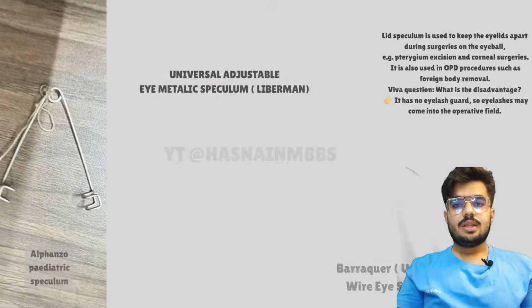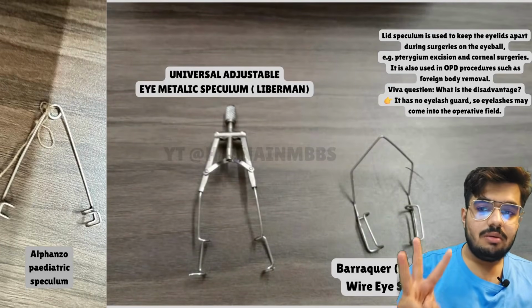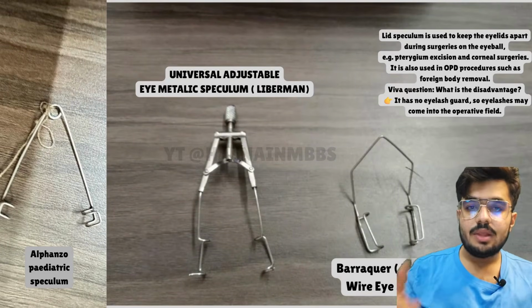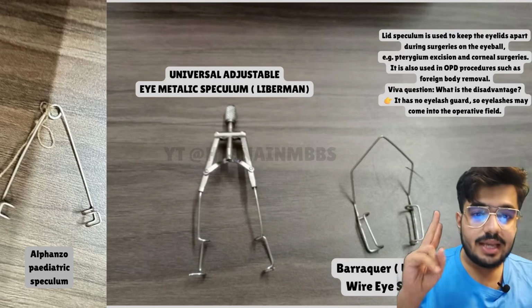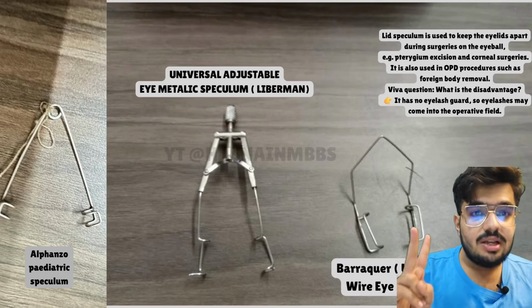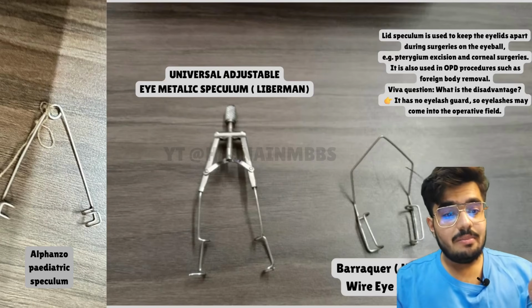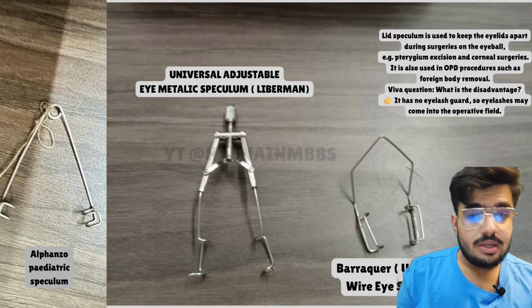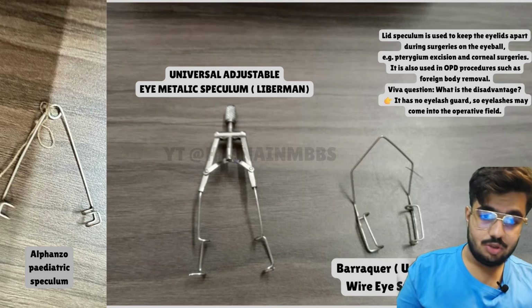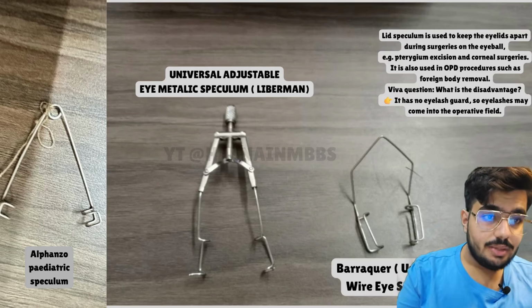Now let's go further. Now we'll talk about the eye speculum. We have three most common speculums over here. Starting with first, Alfonso pediatric speculum. Second one is our universal adjustable metallic eye speculum, also known as the Lieberman speculum. Third one is our Barraquer universal wire eye speculum. Barraquer is very common. It is usually put in our instrument Viva. So remember all these three eye speculums.